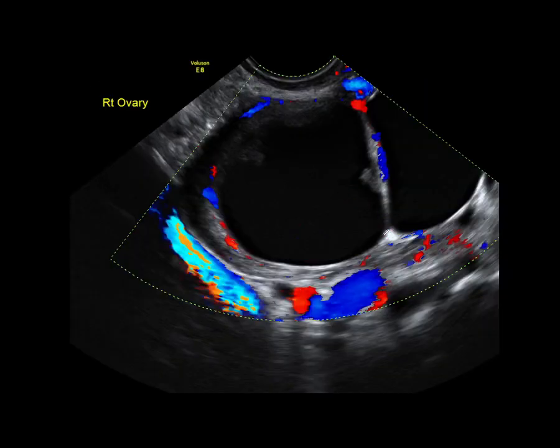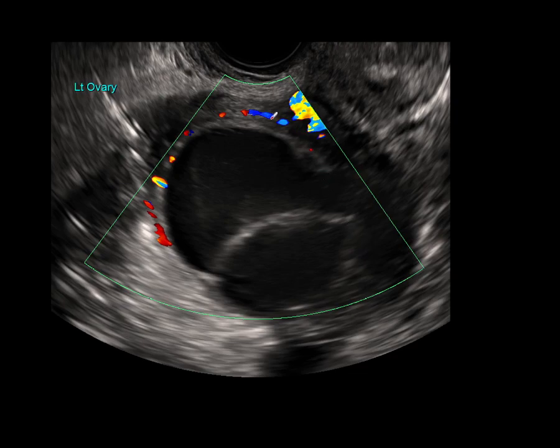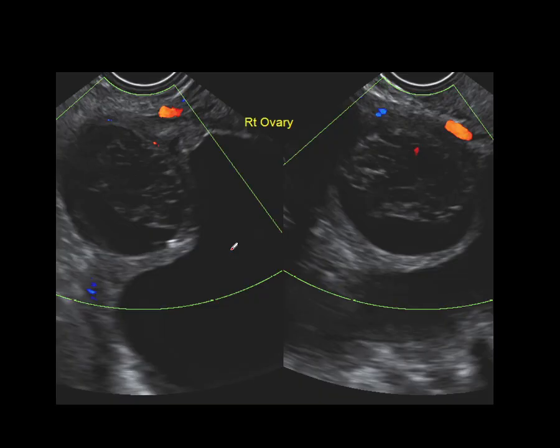Here's a more cystic hemorrhagic cyst with relatively little solid elements internally. The solid elements don't have enhancement. There's strong peripheral enhancement, which is not unusual. Another example, peripheral enhancement, and you can have a multicystic appearance. This loculated appearance is quite common in hemorrhagic cysts.